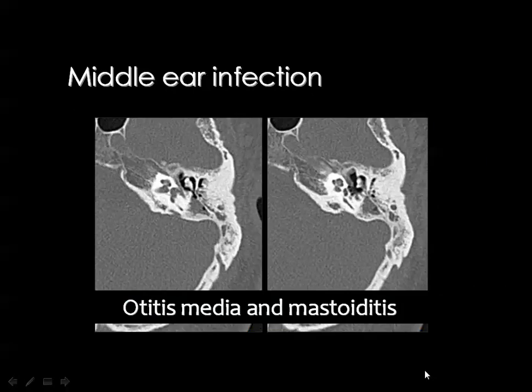Then we came to infection of the middle ear. Here you can see some fluid inside the middle ear cavity.